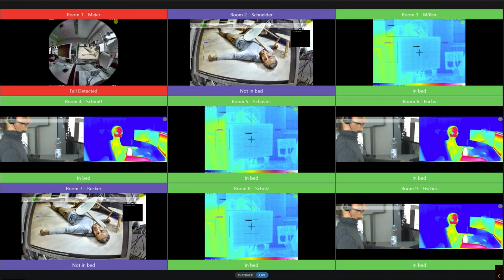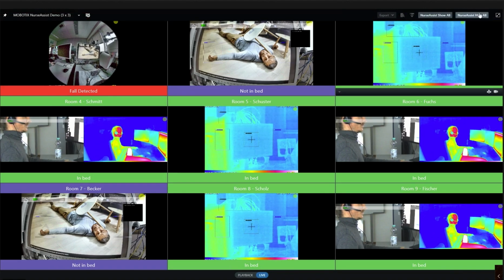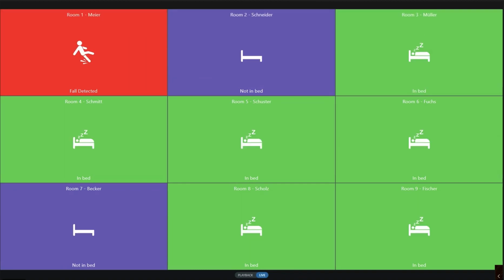In a modern world, we're using an intelligent system by switching to this nurse portfolio virtual view, where we quickly enable the live streams. The nurse can identify if everything is okay, or whether someone needs special care. And when the virtual tour is done, we can switch back to the normal status tableau and again keep the privacy of all the people involved in the hospital or in the elderly care.